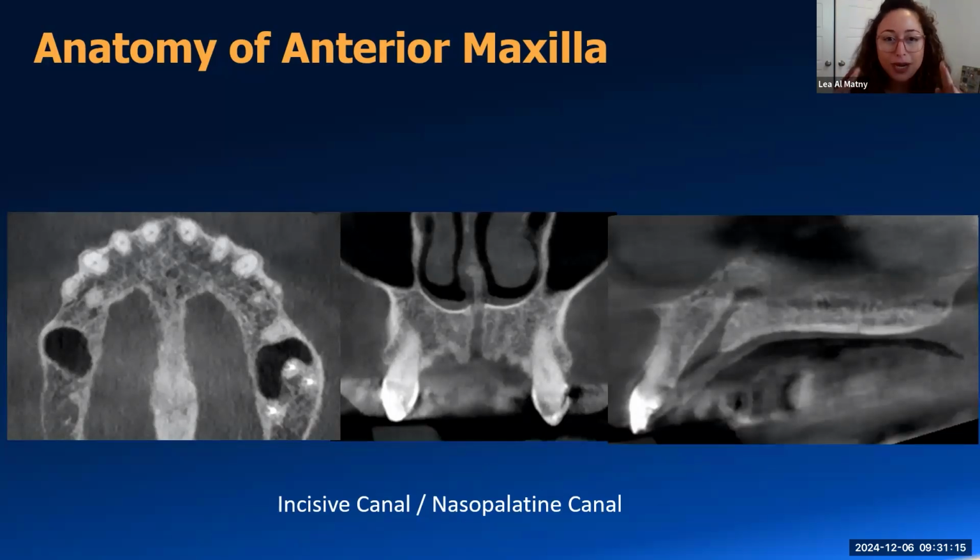So there's not as much pressure on the canal to be restrained anymore compared to actual pathology, because you won't see any mass effect on the cortical plates. You won't see a ballooned out lesion in the midline of the maxilla. It would just be homogeneous, larger from the floor of the nasal cavity to the oral cavity.